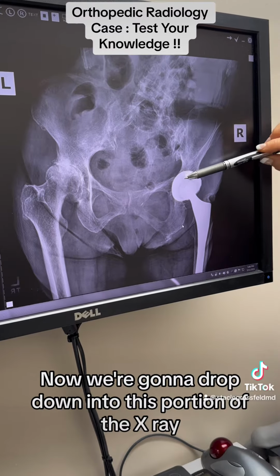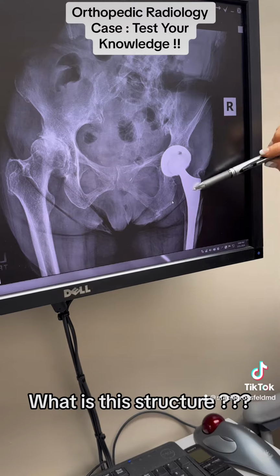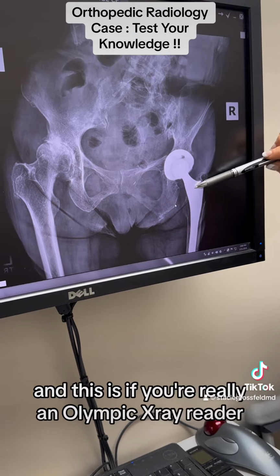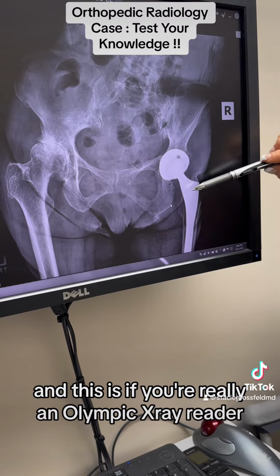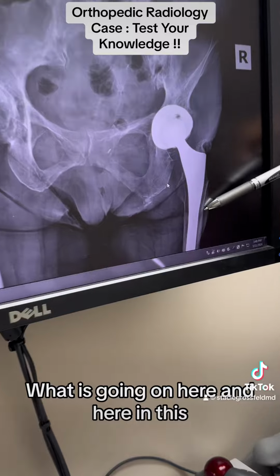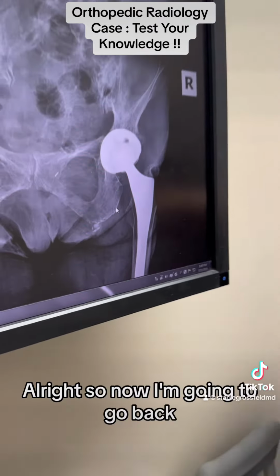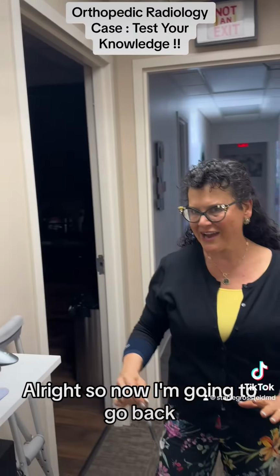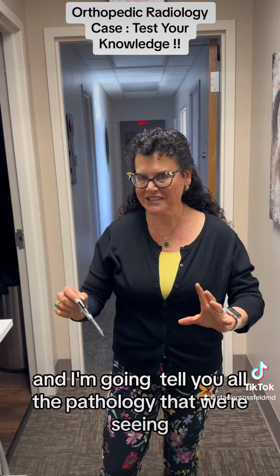Now we're going to drop down into this portion of the x-ray. What is this structure? And this is if you're really an Olympic x-ray reader, what is going on here and here in this x-ray? All right, so now I'm going to go back. We're going to look at the x-ray again, and I'm going to tell you all the pathology that we're seeing.